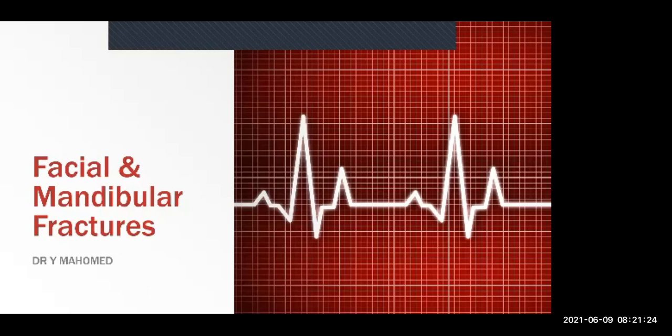All right, so today we're going to be looking at a lot of x-rays. And we're going to be looking at a lot of x-rays where when you look at them, you're going to be like, everything's fine here. Why is this idiot showing us these x-rays? And then we're going to look at them a bit more closely and you'll be like, oh my God, this person is not okay. I would have sent this person home.